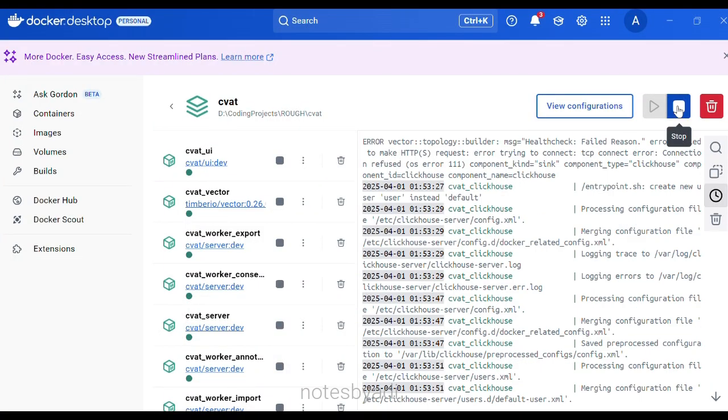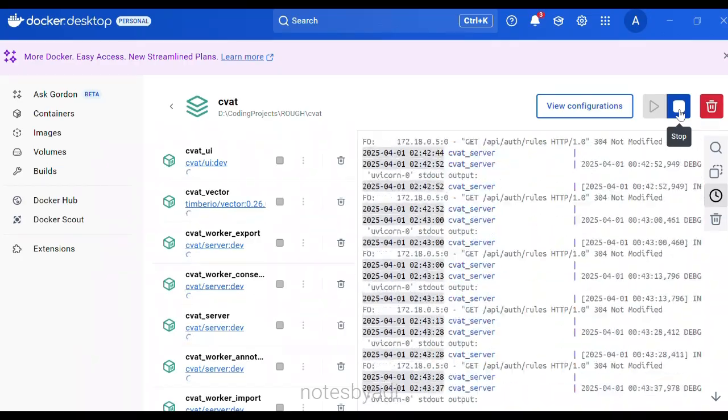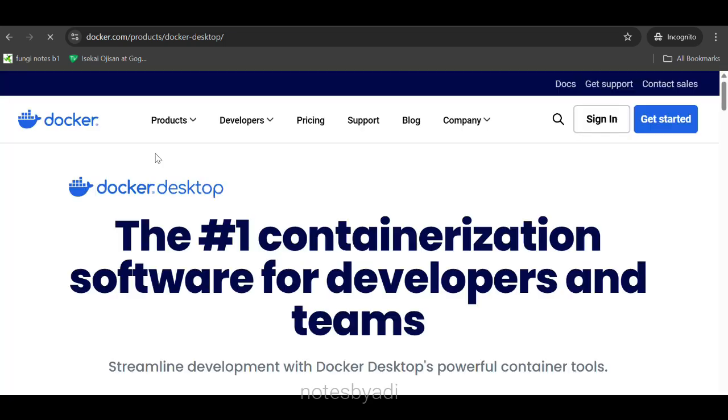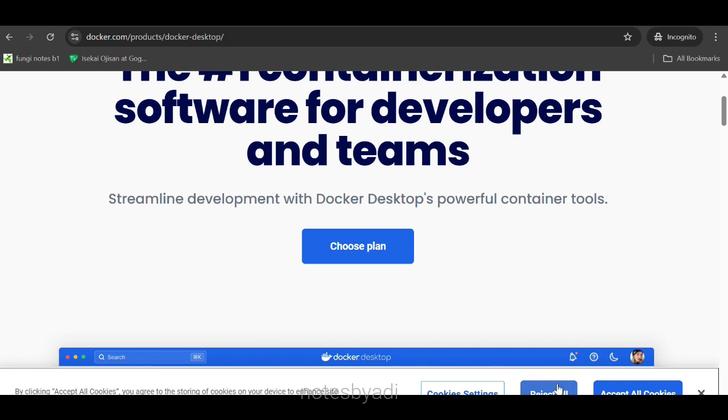First off, to launch the CVAT platform, we need to launch the Docker container for the CVAT server. This is all freely available on GitHub, so I am showing the process to install both the Docker software as well as the CVAT code repository in this video.